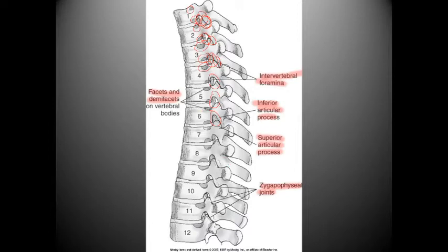Also, we have vertebral body, pedicle, transverse process, spinous process, and I do believe that is it. Also, we have the intervertebral disc, as we can see, and it'll be demonstrated on CT as well.